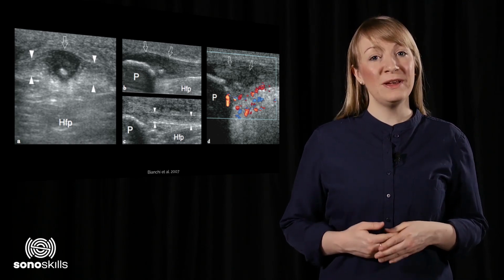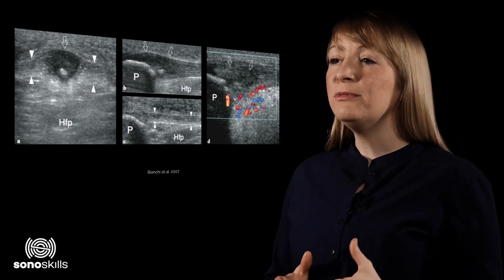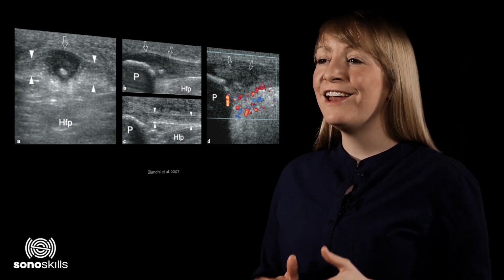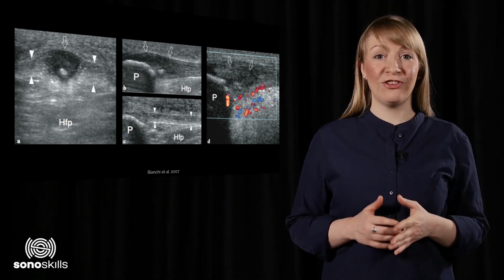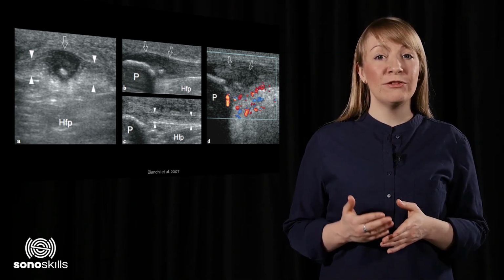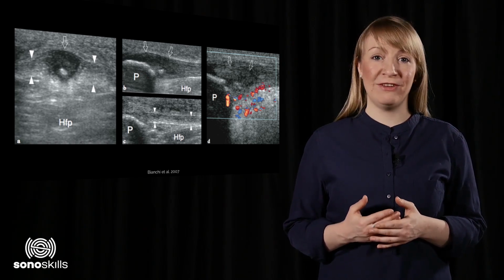This conclusion should be confirmed by making a left-right comparison. Measurements of the tendon thickness, tendon cross-sectional area, tear size and calcification size have to be made to accurately document the pathology for diagnostic and/or evaluative purposes.